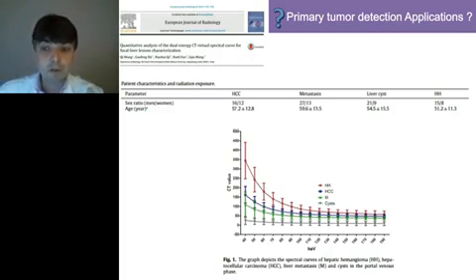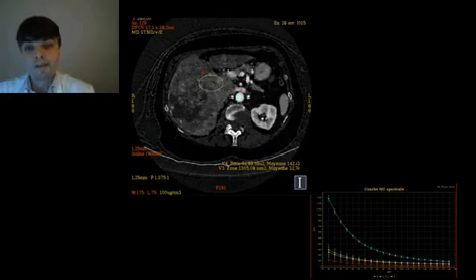So if we could provide for all images an attenuation curve of a tumor that we're going to look at, well, then we can determine the nature of a tumor. That's work in progress. But based on a tumor analysis in itself, not making the analysis of the nature of the whole tumor, we can actually show that there are different components in the tumor. And in oncology, that's a very usual presentation of tumors. Actually, in the tumor, we can distinguish different portions.